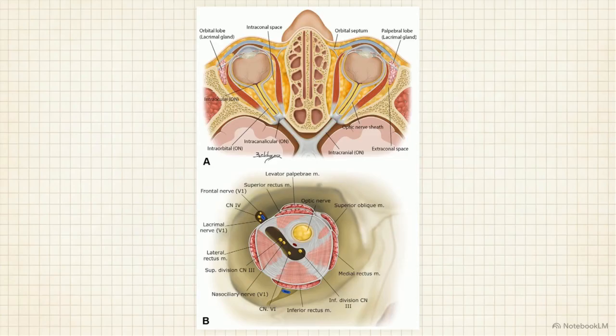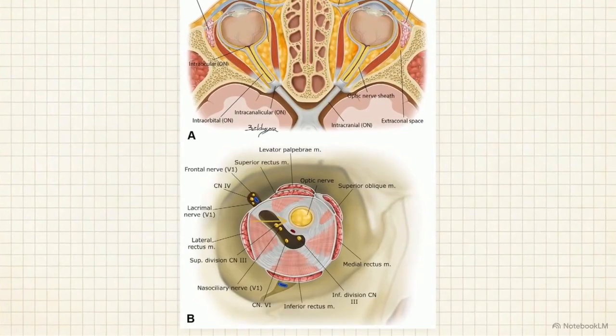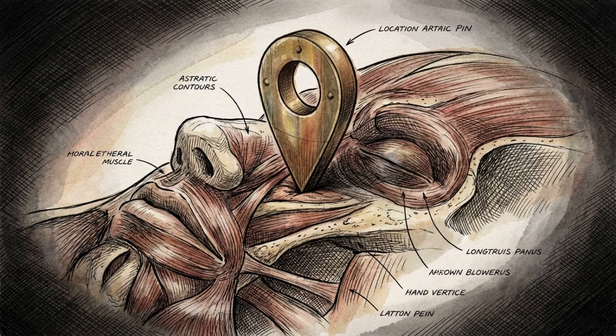This normal anatomy map segments the orbit into mutually exclusive zones: the central intraconal fat space, the muscular conal compartment, and the peripheral extraconal space. Finally, we isolate two highly specialized structures: the optic nerve sheath complex and the superolateral lacrimal apparatus. Location dictates statistical probability. Pinning a lesion's exact coordinate to one of these 5 zones instantly narrows the differential diagnosis.